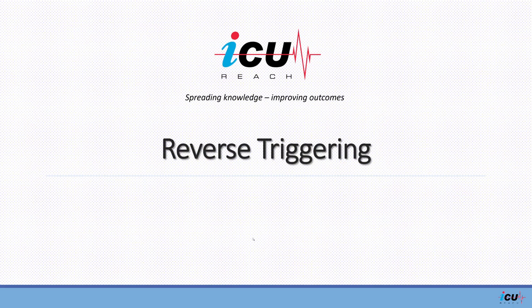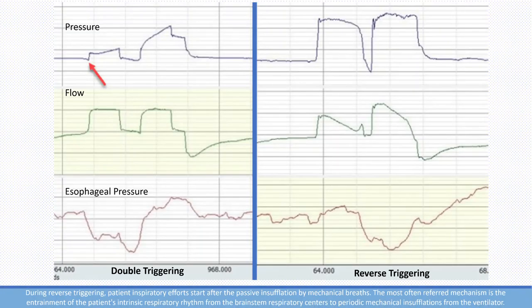Hello everyone. Based on the request of some of you, I will be talking about reverse triggering. I will try to explain it in simple terms so we can understand it and be able to differentiate it from double triggering. I will start by putting double triggering side by side with reverse triggering.